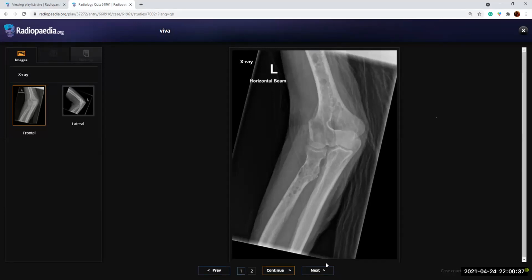Okay, what else can you put in your differentials other than metastatic lesions? Multiple lytic bone lesions. What else can come in your differentials? It could be multiple myeloma, madam. It could be, if the patient is toxic and inflammatory markers are raised, osteomyelitis. It could be lymphoma also.